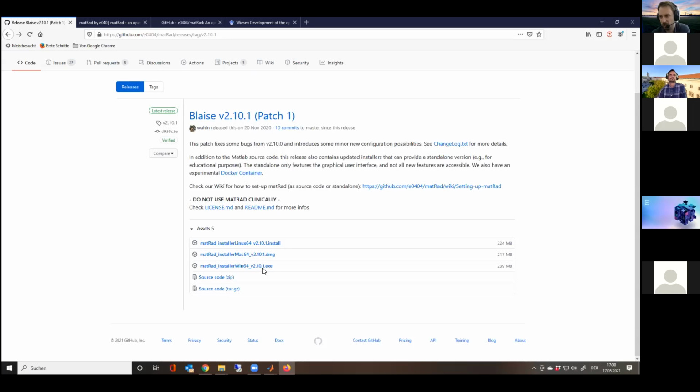They do not want to install a functioning MATLAB system and give you a license for free, so they let you work with this runtime. You may have experienced this with other programs where you have to install the Visual C++ redistributable runtime. It's a similar thing: the interface and the libraries need to be provided. So the installation is not 200 megabytes big; something additional will be downloaded. And that's where we go now.